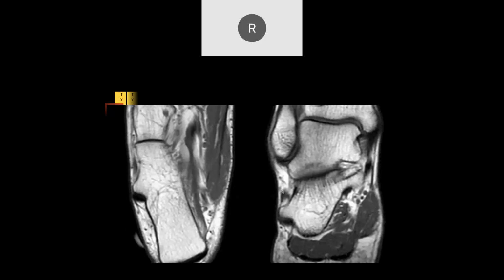All right. Another, looking at the image at the left, it looks like there's a prominent peroneal tubercle, and then the peroneal tendon posterior to it looks fairly normal. Yeah, and again, remember, the peroneal tubercle is always anterior to the longus unless the longus is displaced. Brevis is anterior to the peroneal tubercle. And on the coronal images, we can see a nice prominent anterior peroneal tubercle here with the brevis on top and the longus on the bottom.